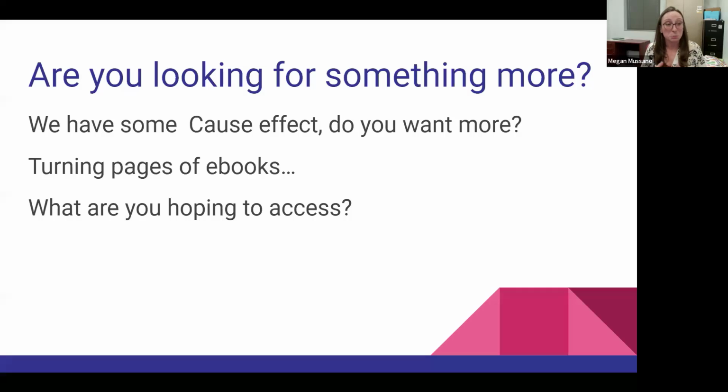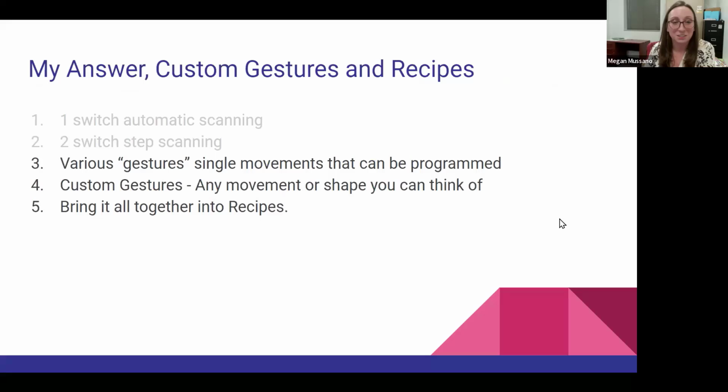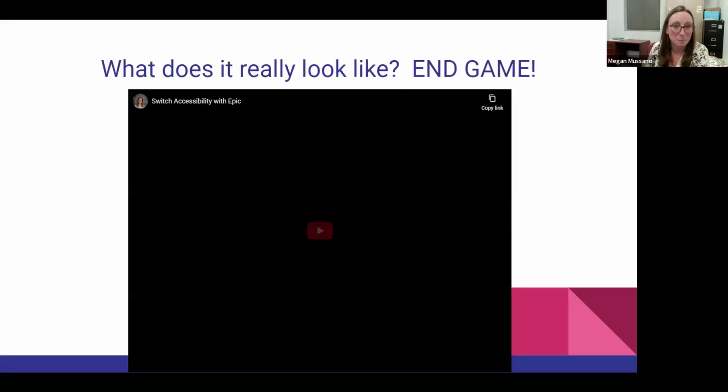So what we've started to do is program our iPad so that you can turn the pages of a book or something more. So hopefully you guys are here to learn something more. And how do we do that? Custom gestures and recipes. Let's bring it all together.